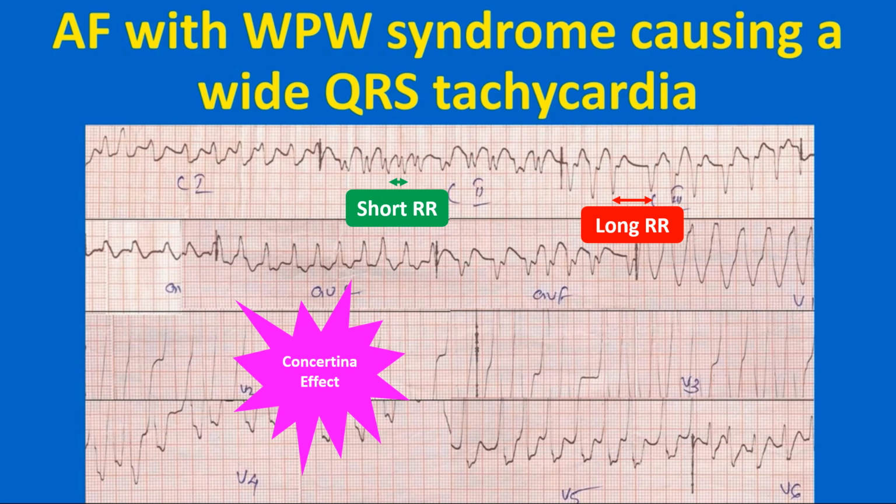Moreover, post-conversion ECG will show classical features of WPW syndrome with short PR interval, initial slurred part of QRS known as delta wave, and secondary ST-T changes. Therefore, the dictum that we should always take a repeat ECG after treatment of any sustained cardiac arrhythmia.